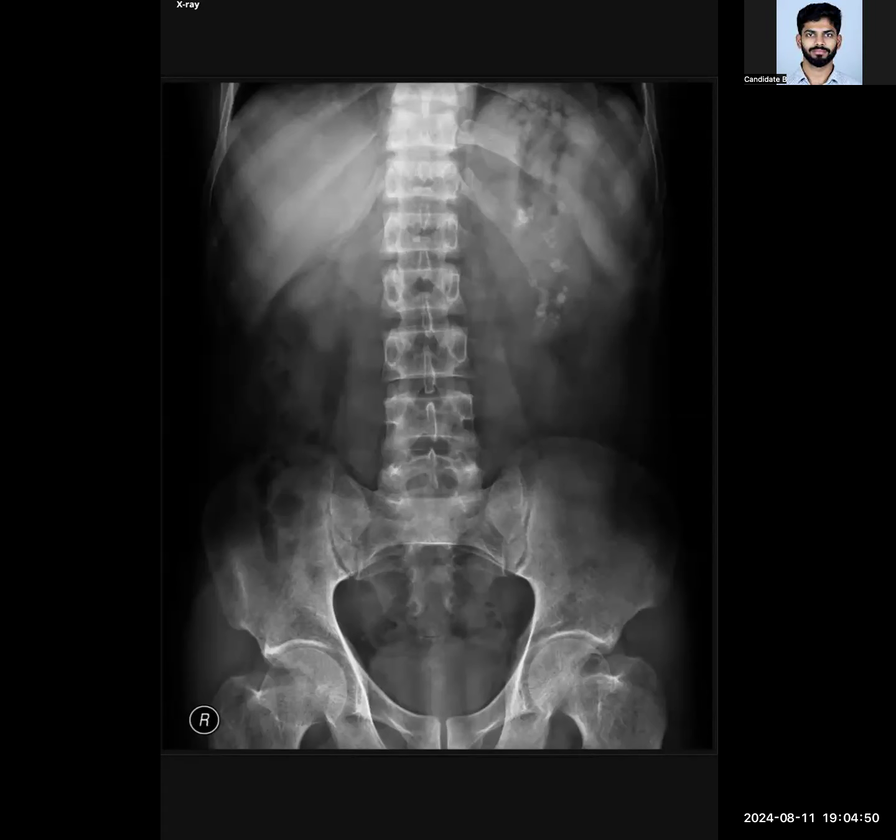Provided is a frontal projection of abdomen and pelvis in an adult patient. The striking abnormality I can see is multiple hyperdense calcific densities corresponding to the renal medulla on the left side kidney.